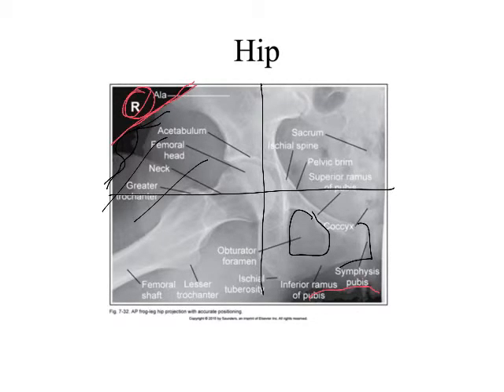Can we see the greater trochanter on this? Not really, but what do we see? We see the lesser trochanter in profile now. We would not want to see a whole lot of the lesser trochanter on the other image, right? Because that would mean that the patient's feet were not appropriately... We did. Yeah, we did see some. We would hope to see less because the more lesser trochanter that we see on that image, the less greater trochanter we're going to see, if that makes any sense.